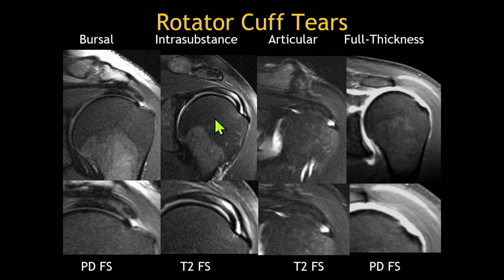So first, rotator cuff tears. It's probably the vast majority of MRIs that are ordered for this specific indication. And it's important that you have the phraseology in mind when you're trying to describe these accurately to your orthopedic surgeon, especially if they're going to go in and do some sort of intervention, such as a shoulder arthroscopy. So it's important to identify anatomically the location of these cuff tears, whether it's along the bursal surface or the superior surface where that subacromial subdeltoid bursa lives.